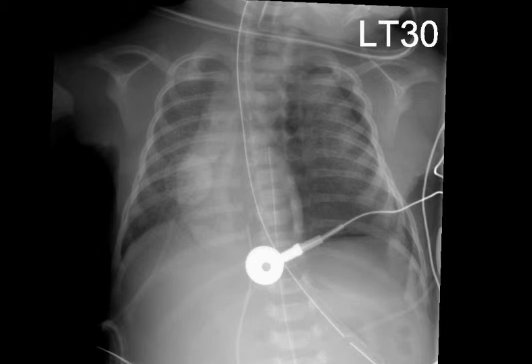I'm going to spend some time now talking about pneumothorax. I've shown you several obvious pneumothoraces already. This is another patient where you obviously see the edge of the lung with air lateral to it in the pleural space. But unfortunately, most pneumothoraces aren't this obvious, so I have to show you the more subtle examples that you need to look for.